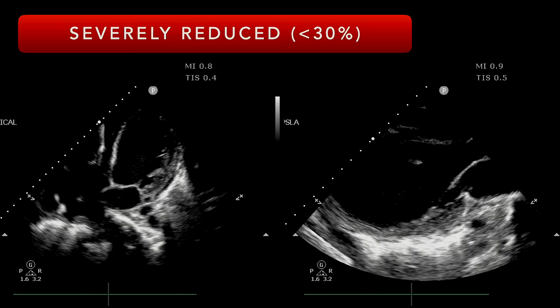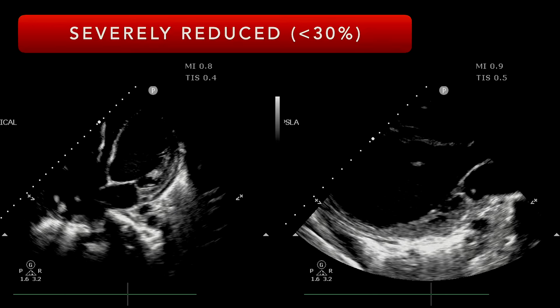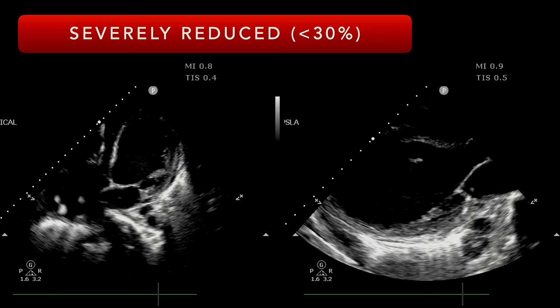And so those are the three examples of normal, reduced, severely reduced that we can set as our benchmarks as we're looking through this visual estimation technique. So as we conclude today, what I'd like to do is walk through a number of pitfalls, areas where I've seen that you can get yourself in trouble as you're trying to interpret this, and where we find limitations in our ability to estimate the left ventricular ejection fraction based on visual methods, and we'd have to rely on some other techniques to help us out, right?